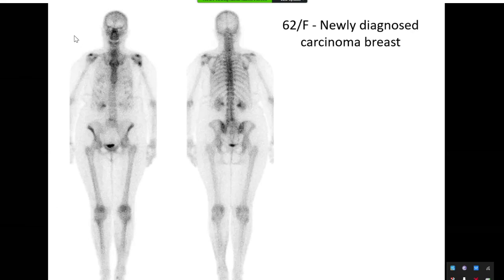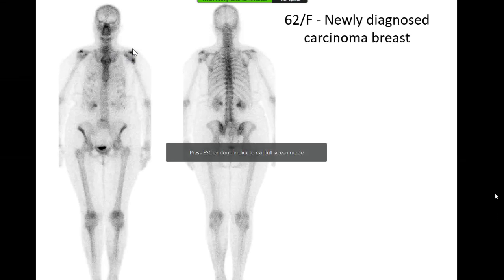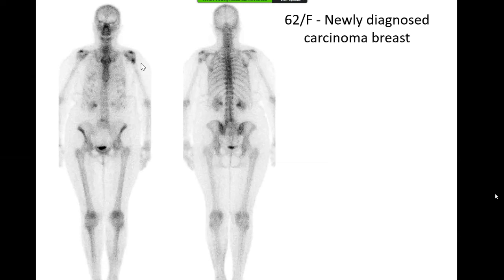So be aware that what you are pointing out here is the uptake in the acromial process. Generally, again, it would be normally seen and often very symmetric. Likewise, when the patient gets a little bit above 40 years of age, you tend to see uptake around the joints because of underlying osteoarthritic changes.